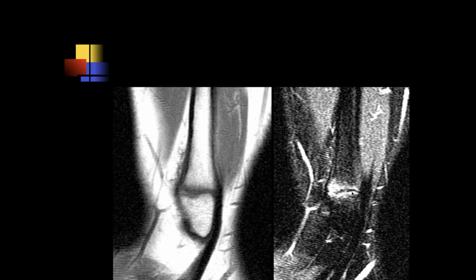Looking at this one sagittal image, it looks like there is quite a bit of edema. I don't know how old this patient is, but it looks like there's quite a bit of edema of the lateral tibia. I don't know if this is just poorly healed, or this is just Salter Harris 1. Okay. This is Salter Harris 1.